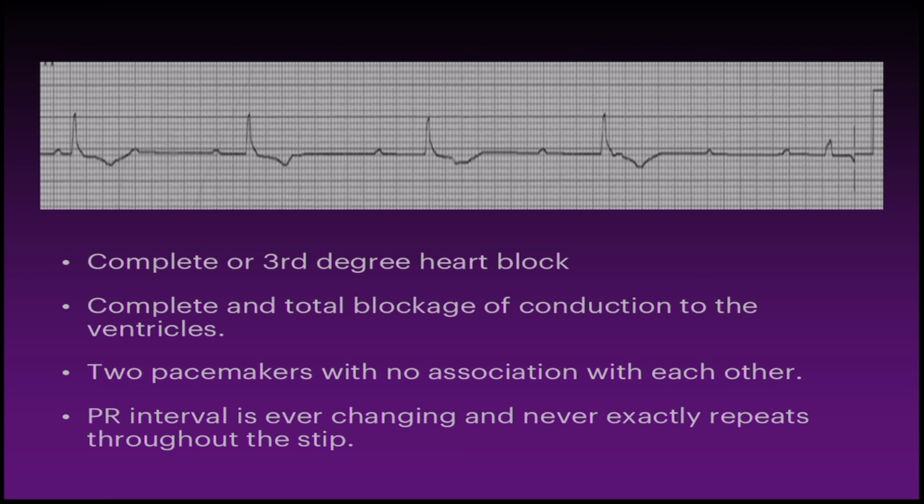A third degree heart block can occur at the level of the AV node or below, and that is where you can see variability in the QRS width. For example, you can see a junctional escape QRS complex, which is what we have here. So that's a junctional escape QRS complex, or you may see a ventricular escape QRS complex, where you would see a very wide morphology on your QRS complex, because the ventricular depolarization is going to move by direct cell-to-cell contact, which is much slower, and you get a longer QRS complex.